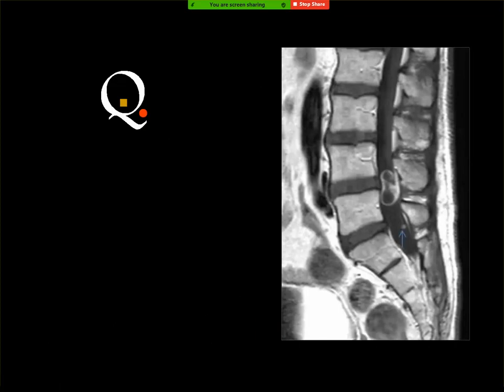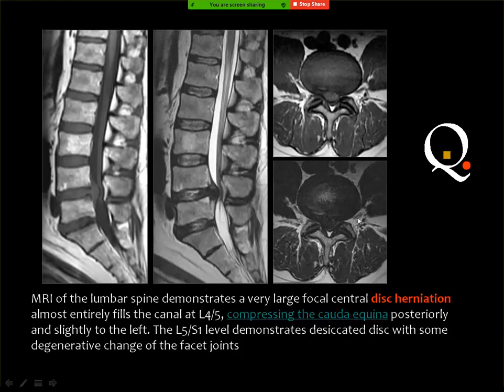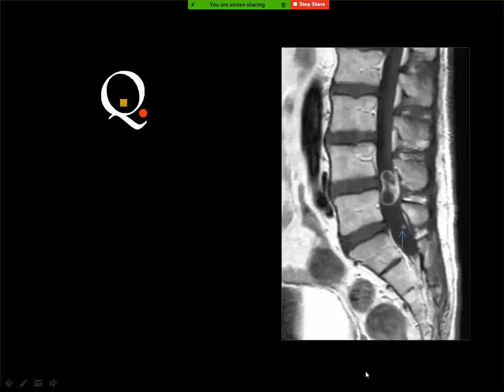Doctor, with your permission, the case before it has a hemangioma. Hemangioma, where? In the vertebral body, a hemangioma. This one. Yes. And it is an incidental finding, and you may mention it, of course, in the exam.